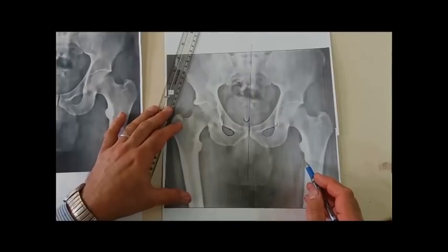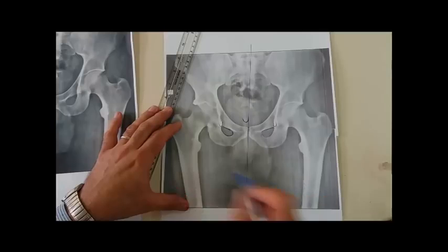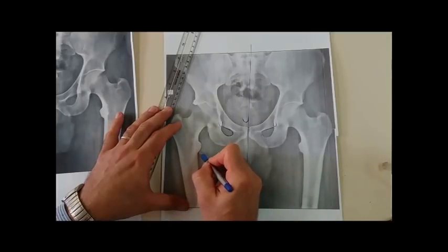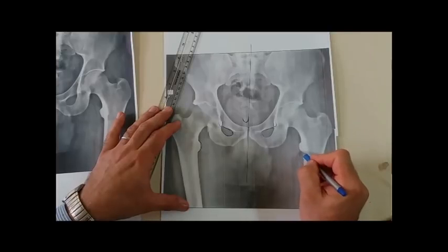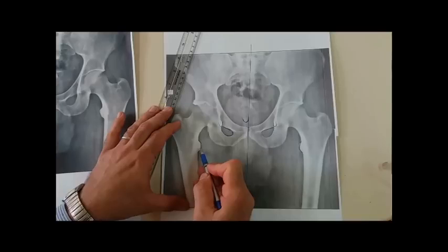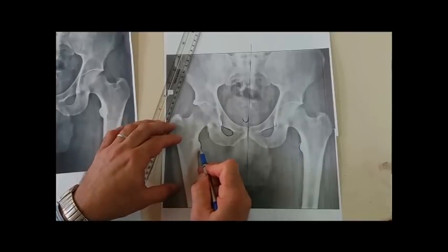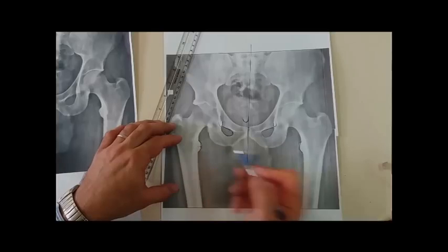Regarding the femoral side, how will I check that this is an adequate AP or not? The lesser trochanter should be partially uncovered. As we know, it is posteromedial. So in a true AP, the majority of it is hidden behind the medial cortex. Only part of the lesser trochanter is visualized.